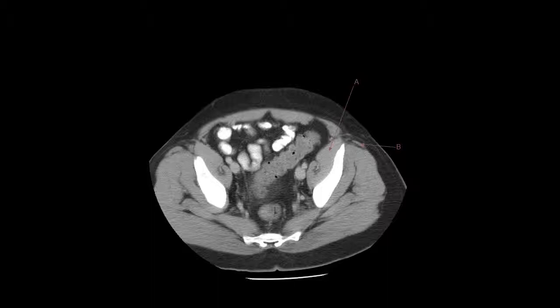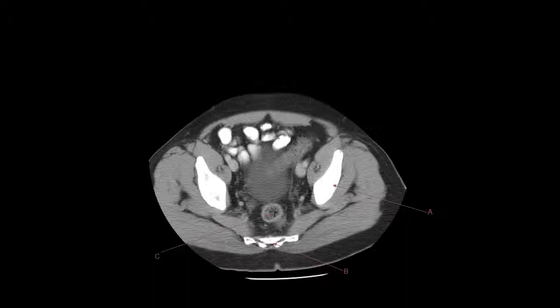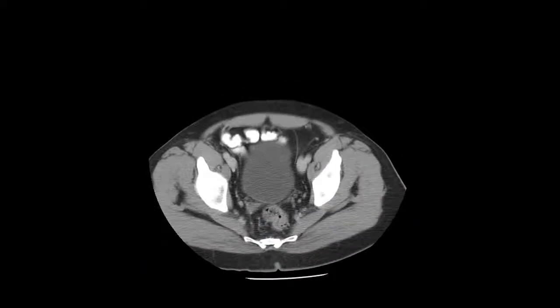Again, here's the sigmoid colon coming across the rectum, so it's got that almost S shape to it coming down from the descending colon. In B, you got some structures there, the iliopsoas, tensor fascia latae. You got the rectum now, and we're actually down below where most of the sigmoid is at the moment. Body, the ilium, and then the sacrum at the very inferior part of it, essentially.